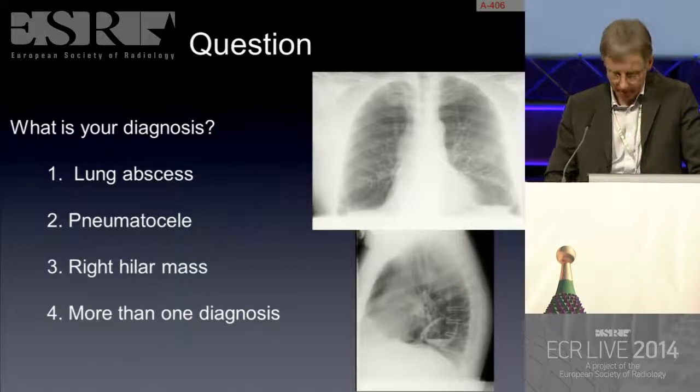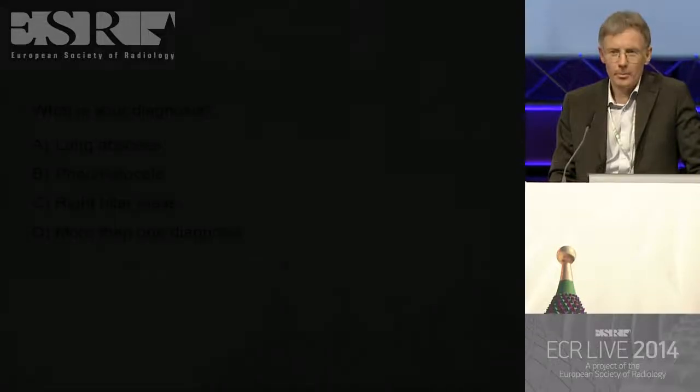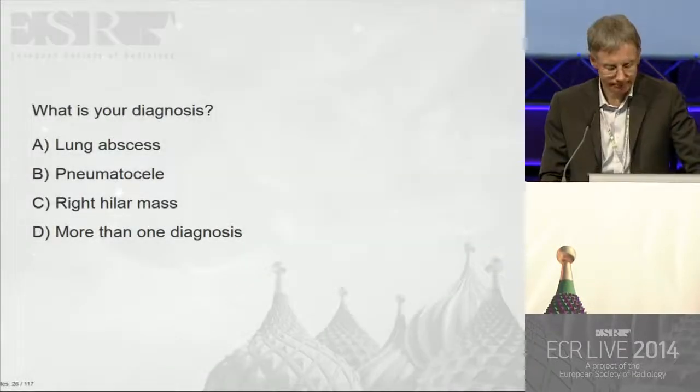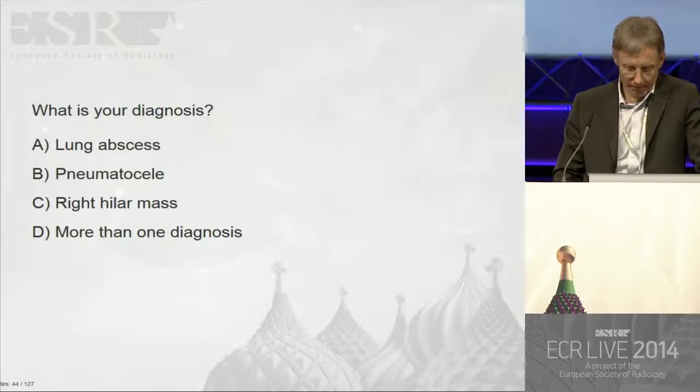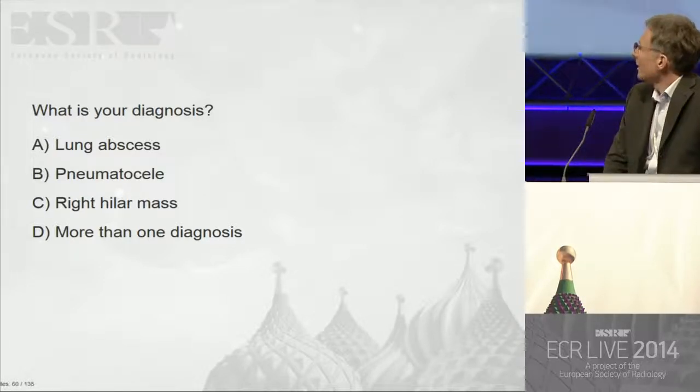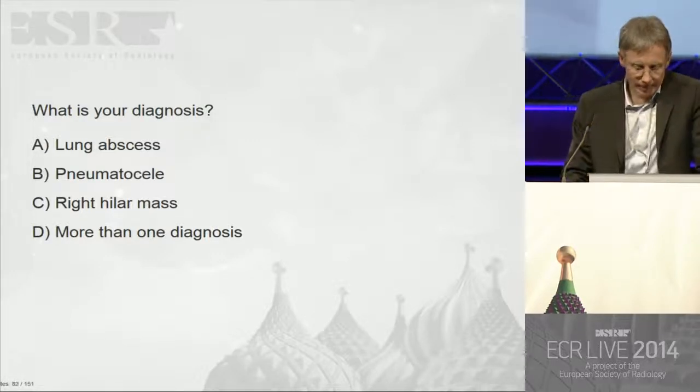So this is 1 week after a motor vehicle accident. Please vote now.